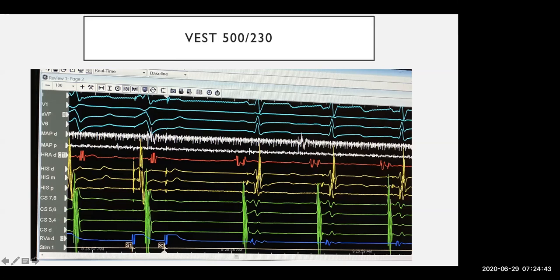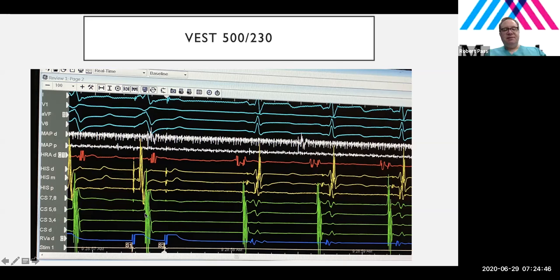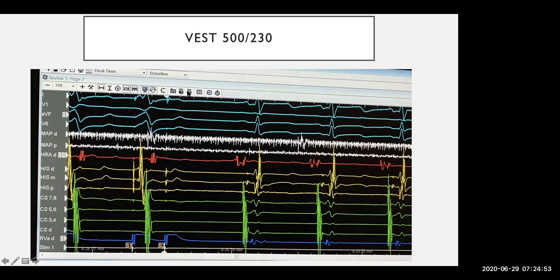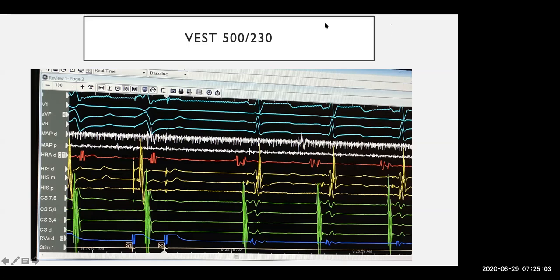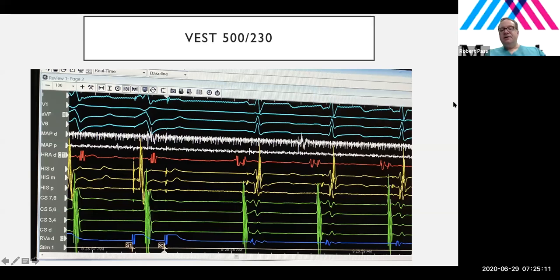Oh, yeah, right. And so here we are, V pacing, we capture the V, we have VA conduction, then I put in a V pacing spike, and what happens on the surface electrocardiogram? It does not capture this pacing when you pace. Correct. That's correct. So what will we call this then? So this is the ventricular refractory period. That's right. This is the ventricular effective refractory period, or sometimes we call it the VERP.